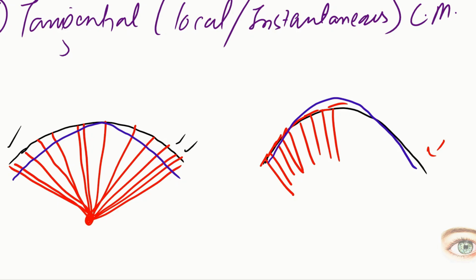Now, you have to look at these maps side by side, and you also have to look for the K readings, K1 and K2. You also have to look at their readings. So the normal keratometric reading is between 43 and 44, all right? And a minus 0.75 diopter difference is quite normal because we all have physiological astigmatism of minus 0.75. So you have to look if the readings are normal.